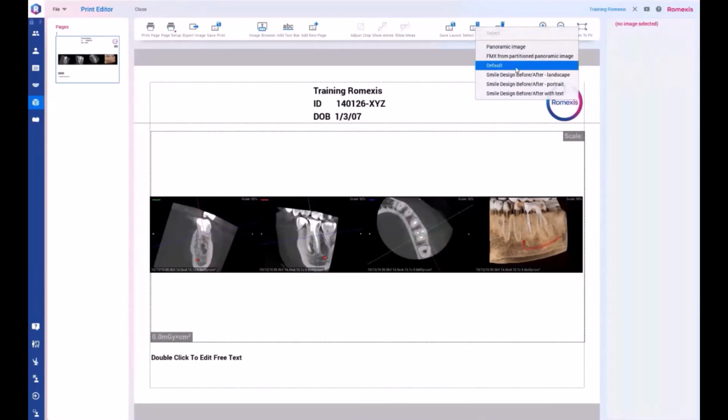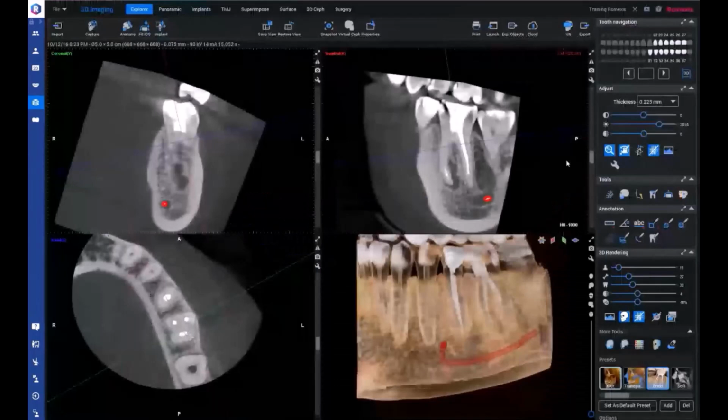You can configure different templates so that it's easy to use with your own logos and clinic information, and then of course the patient information comes. But I won't go into more detail in this session, because we also have a nice tutorial video on that.